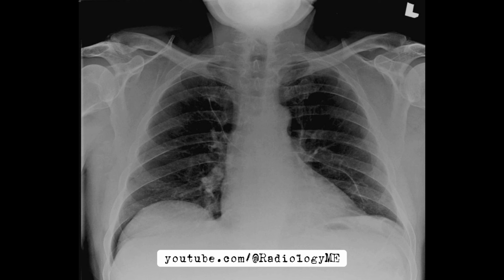Once you've reviewed the previous imaging, it's time for the lateral chest radiograph. This gives us more information, especially since we want to make sure that this isn't some tricky artifact playing tricks on us. Next up, inform the oncologists. This is an urgent situation. You don't want the line to cause any complications, so getting the team on board is critical.